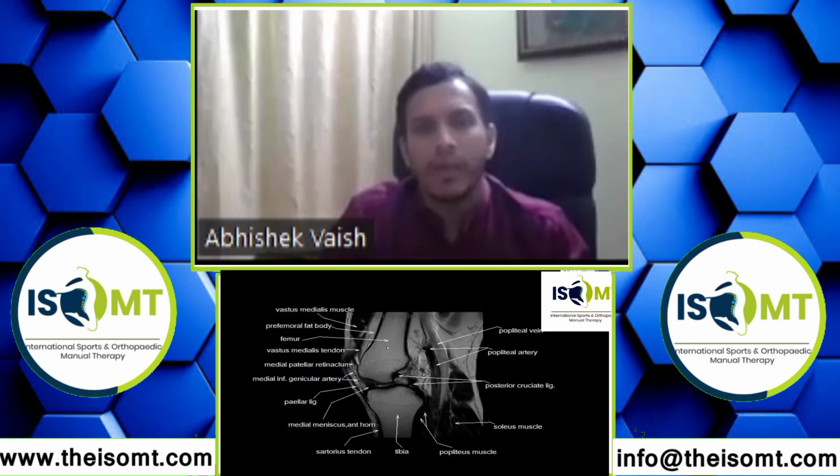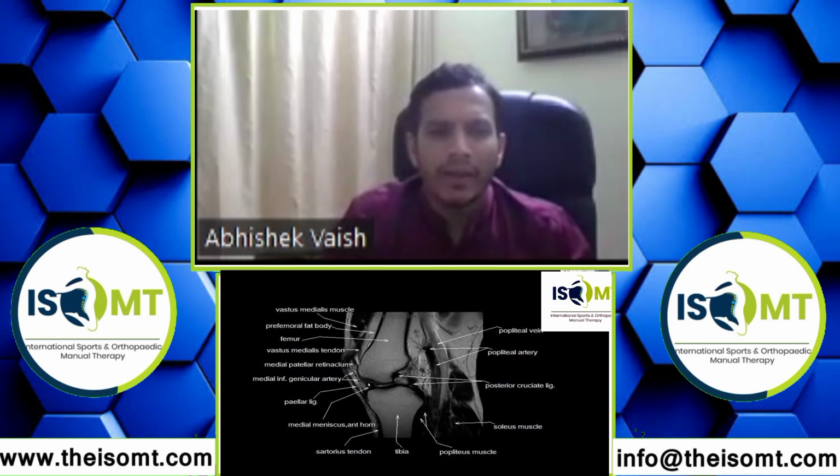So this is an example of a sagittal cut. Again, you see the femur bone, the tibia bone. Then you can see the posterior vessels, the popliteal vein, the popliteal artery. This is the posterior cruciate ligament. Then you can see the anterior horn of the medial meniscus, the posterior horn, and you can see the patella in front. And then you can also see the fat pad.